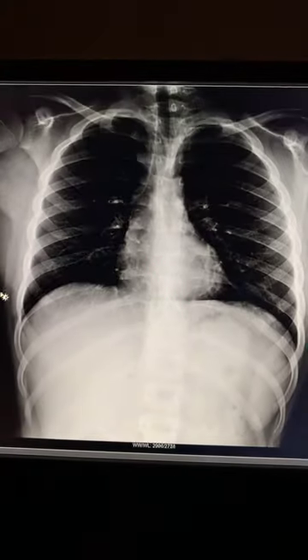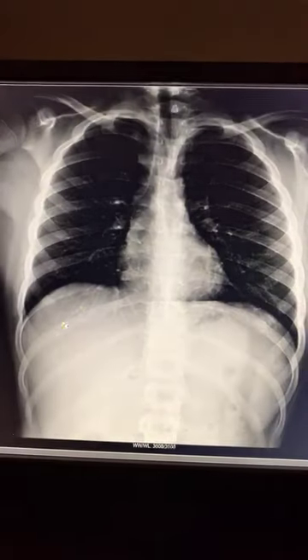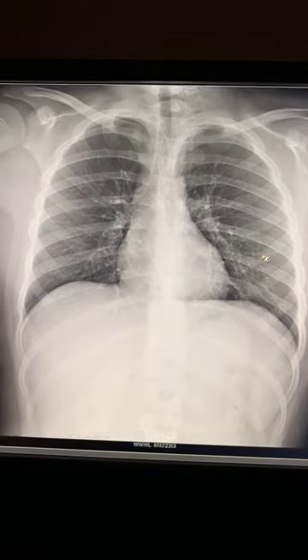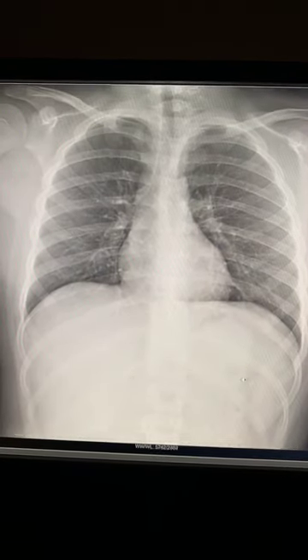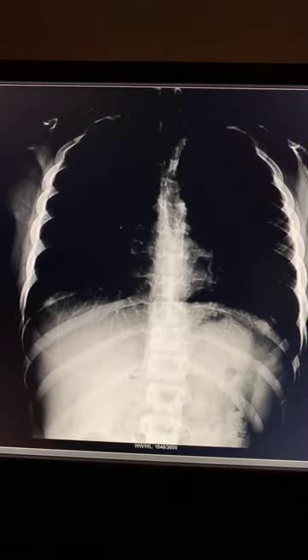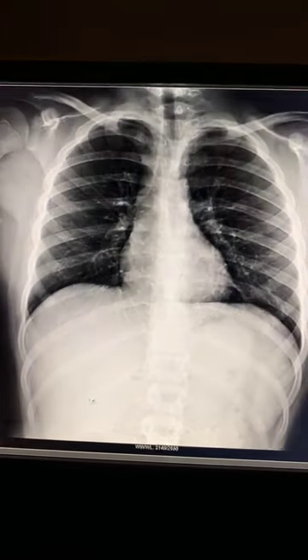When I'm looking at the ribs, I wanna really window down. Can you see these bottom ribs down here, the 12th rib, 11th rib? Can you see that when it's like this? Absolutely not. So what I want to do is I want to do one of these. Look at that. Now you can see the rib, right? Beautiful. See, now you can see the other side. Now you can tell me if there's a fracture or not.